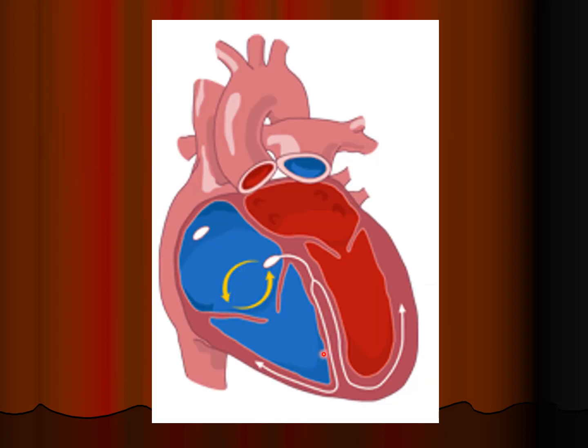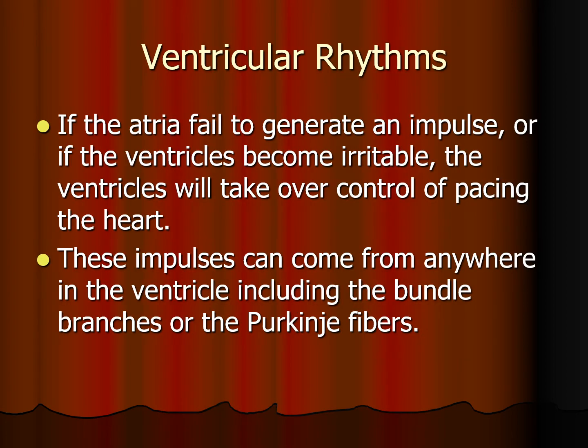All right, so here's our reentry. Somewhere in the atria, because we have a skinny QRS, we have this unfortunate electrical mess going around and around and around, and then we end up with a fast heart rate. So sometimes we'll shock this or give it meds. That's for another class. Okay.